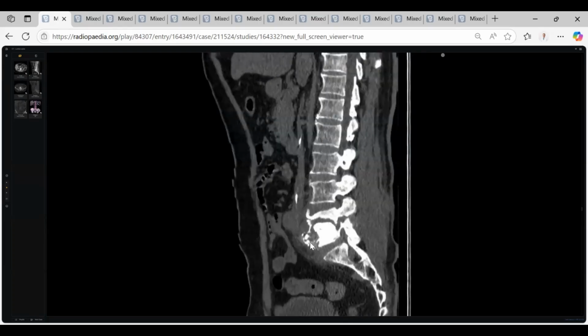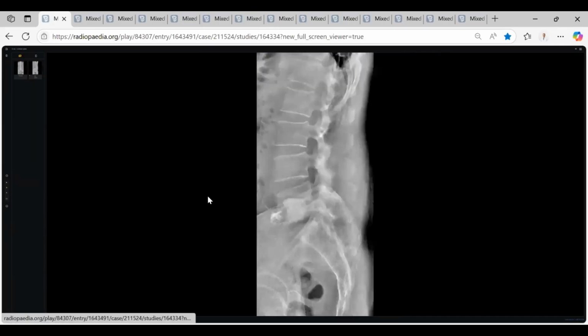Doctor, what happened here? You said there is compression. And what happened after compression collapse? Some retropulsion is there. What happened here, doctor? Anterior after collapse, the L4 vertebra collapse. Is there some sequestration or some bone? Good. After the patient has collapsed, there is some treatment.